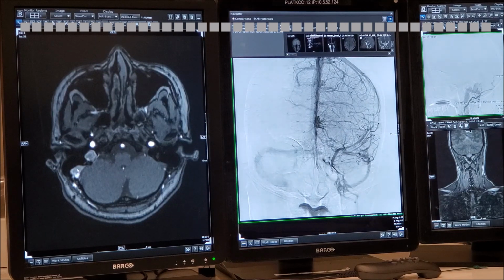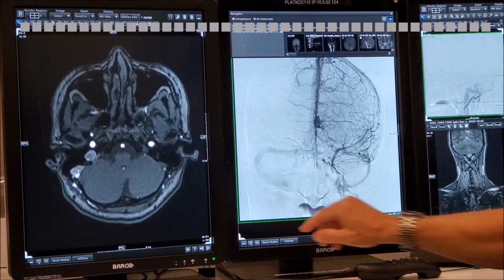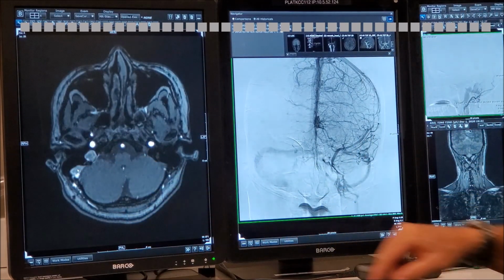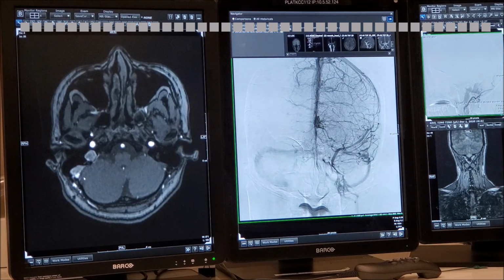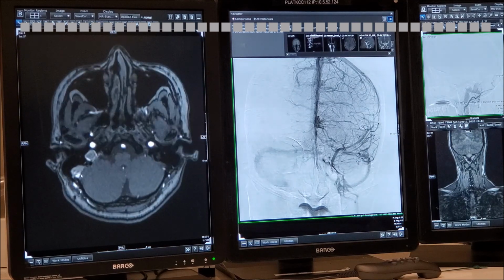We're catching it like this, so you're actually seeing two things. This is the same vessel, but you're just catching it. So I think it's dilution of flow more than thrombi in it. To look for thrombi, MR angio is not the best. It's to use the T2, and then you look at it.